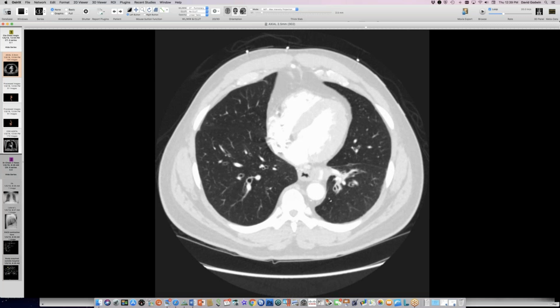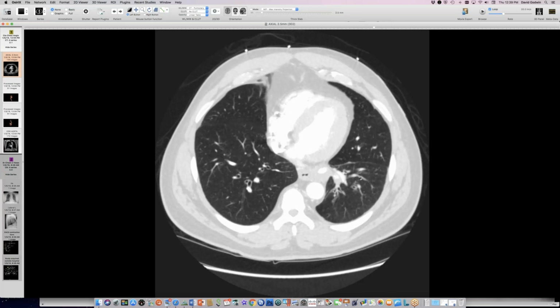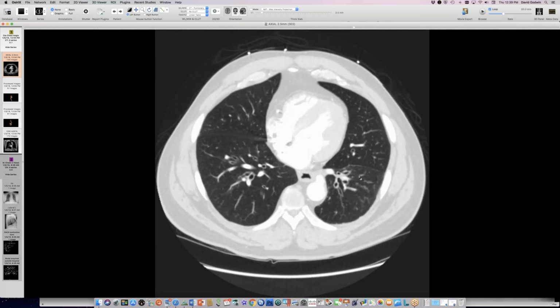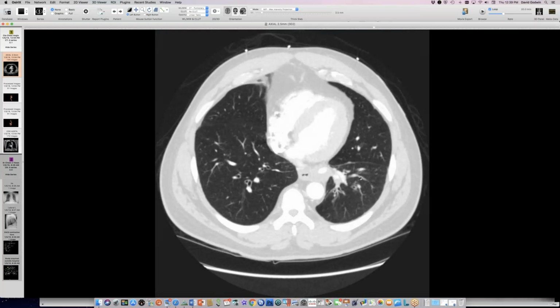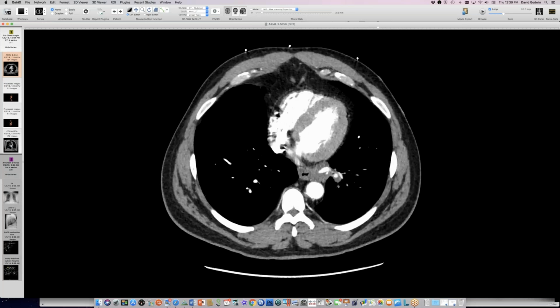But people were a little confused by this case because there wasn't a big lung lesion. Looking at it again today, I do think that there is an emphysematous component. So this is probably part of our congenital abnormality back here. But there wasn't a big thing, and there weren't cysts or fluid levels and things like that. So it was a little hard for people to take this as sequestration, but it fits. We've got a systemic artery, we've got abnormal lung. In this case, it's fairly solid looking.